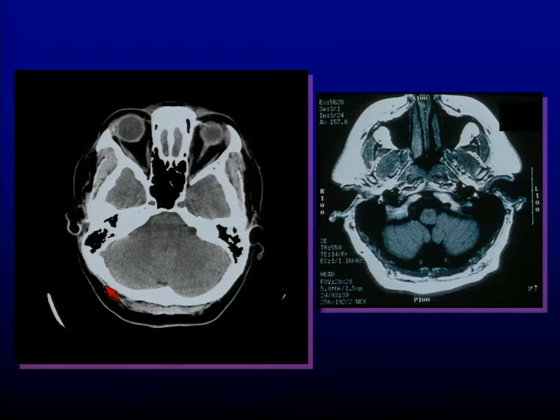Here's a first, somewhat of a low cut. It's not the first cut you're going to see, but it's the first one that I think is getting into areas I care about. So I've come up through the bottom. I see that petrous ridge right there. I see the mastoid air cells. I'm catching some temporal tip and some temporal tip. I have the ethmoid sinuses here. I've got cerebellum, and I've got cerebellum, and I've got brainstem.